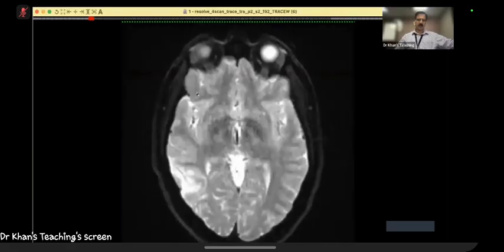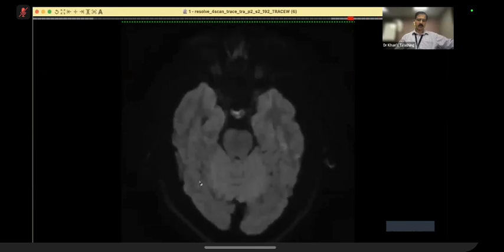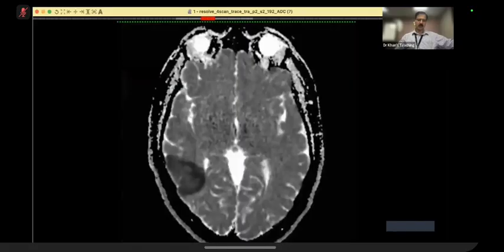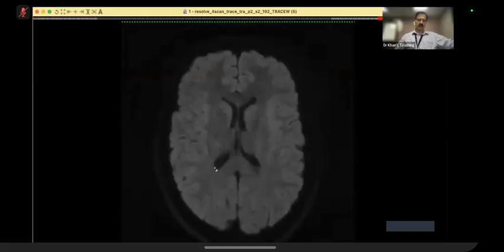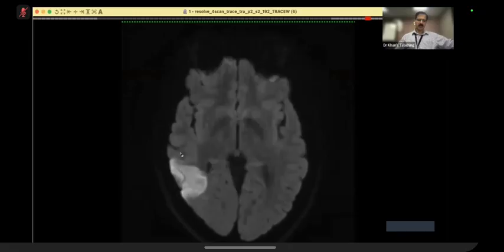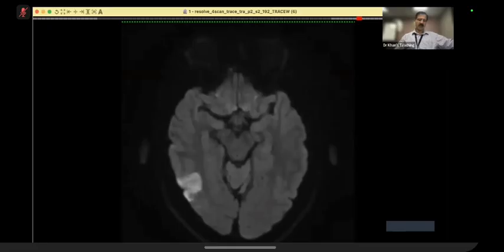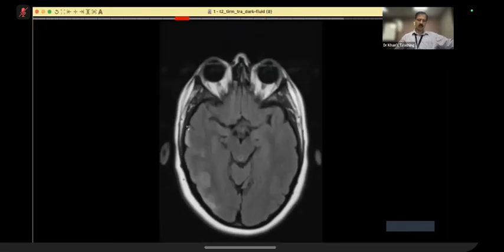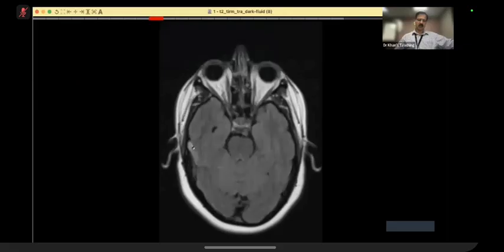And then on this MR, the key finding was restricted diffusion. It was very impressive. Look at the restricted diffusion. Now, try to concentrate here because this is the restricted diffusion. And please remember, on ADC it was also low. But you don't see anything more in this region. You see this thing here. And actually, this is a thrombosed cortical vein, this one.